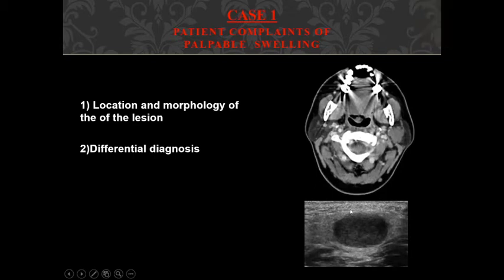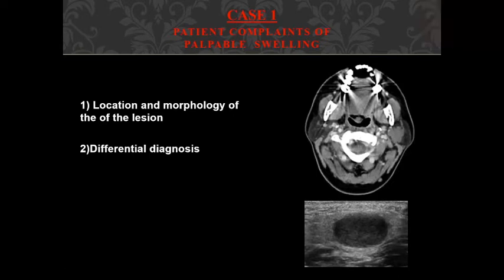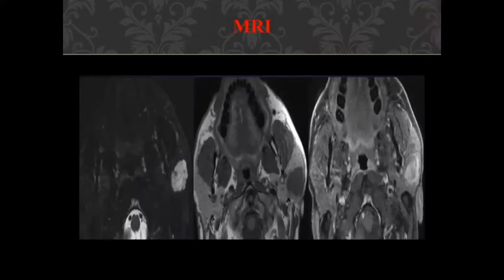Yes, sir. So the location of the lesion is in the left parotid space, right? Yes, sir. So your diagnosis is pleomorphic adenoma, a benign tumor of the parotid, or an enlarged intraparotid lymph node. Okay. So I will give you the MRI pictures of this patient. Can you see it? Yes, sir.